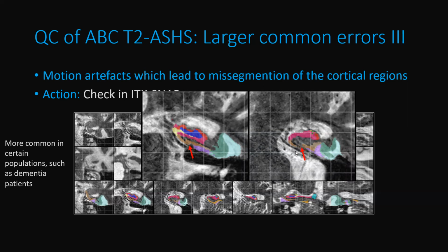So you think you maybe see the borders, but in reality, these lighter motion artifact lines completely fool the automated method, and make it put an ERC label over there, and then it stops, and then it continues there. So it's really something funky going on. This is not biologically plausible, that ERC is located there and then not there and then there again. So yeah, I hope this is a nice example to show that this is an important issue and you need to be really careful about it.